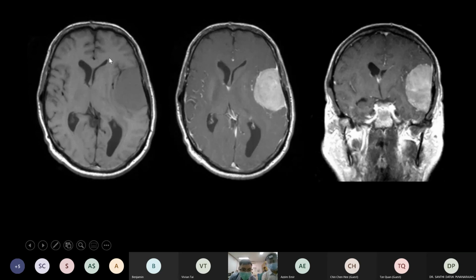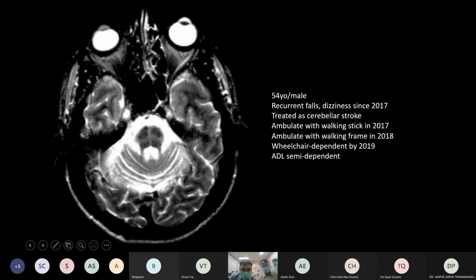So this patient with this MRI image we already discussed just now: hypointense in T1, and then under the post-T1 gado, there is extra-axial enhancement, more like a dural tail. And there's also a cleft actually, but you cannot really see. So most likely this is meningioma. This is a dural tail sign.